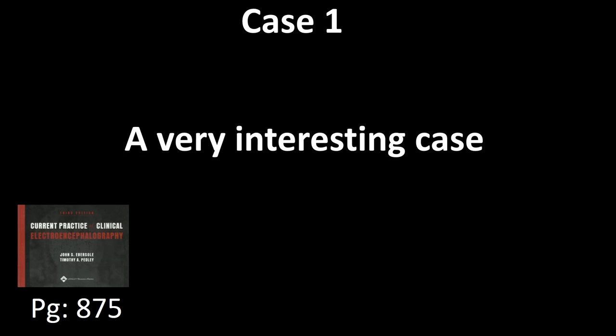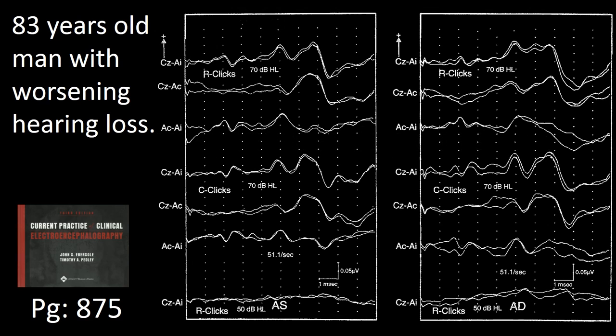This case is very interesting. The vignette is short. An 83-year-old man with worsening hearing loss. The brain auditory evoked responses waves are presented in this frame. I will ease you into their analysis with a question.